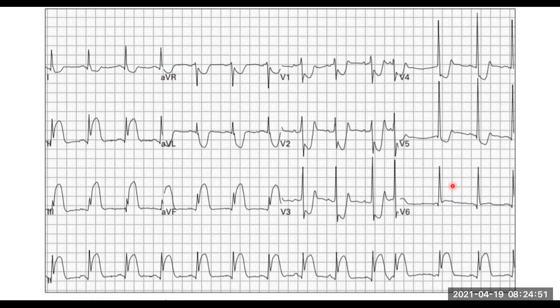Or there's something else that's happening in the heart on that lateral side. Is it also being affected right towards the end? Because remember, you're looking towards the back area of the heart. All right. That's a clue actually to what's happening today. All right. So we kind of know that we've got this whole bunch of ST depression. What's leads 2, 3, and AVF? Which zone are they? Very good. And what do we notice in lead 2, lead 3, and lead AVF?